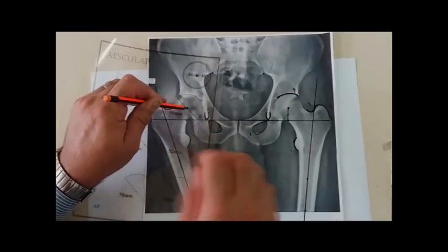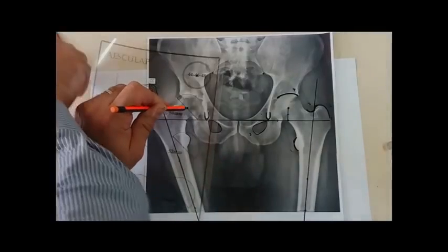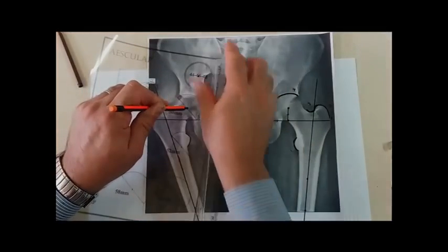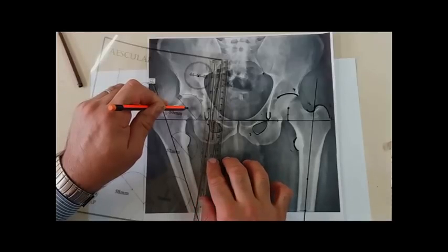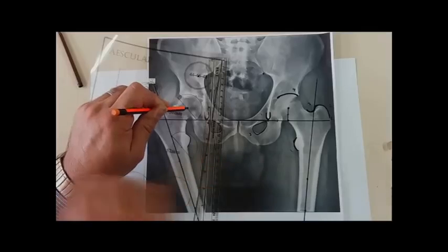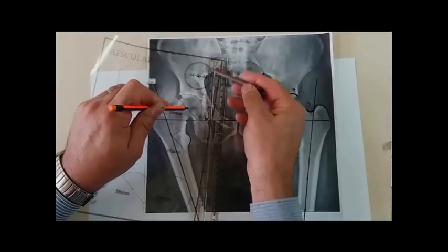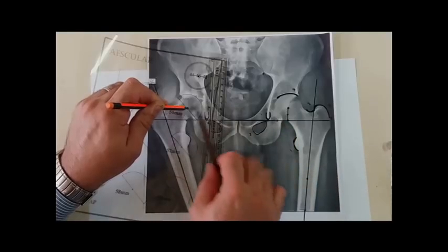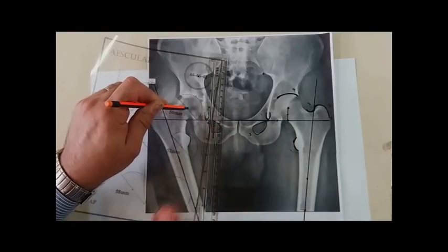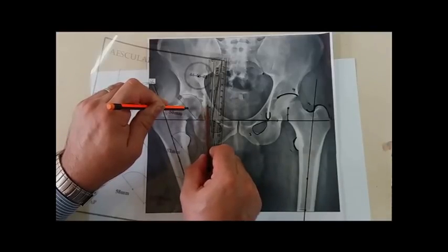The third step is that I should verify that the inferior edge of the acetabulum does not go below the interteardrop line. And another issue that I have mentioned shortly: a line drawn through the lateral lip of the teardrop perpendicular to the interteardrop line. Just imagine this ruler is that line. The medial part of the acetabulum shouldn't pass medial to this line, because this will mean protrusion.